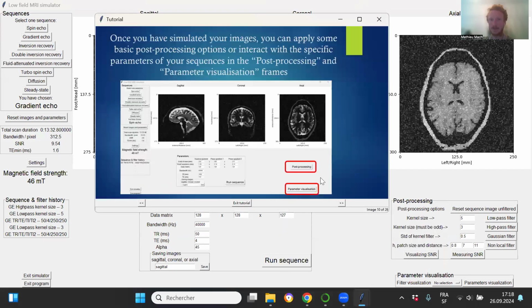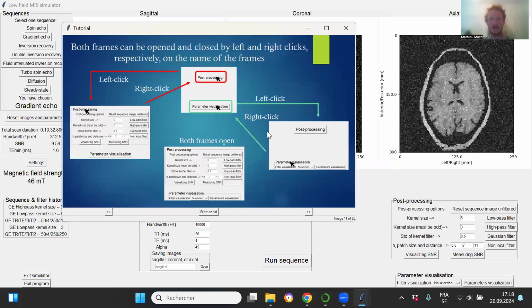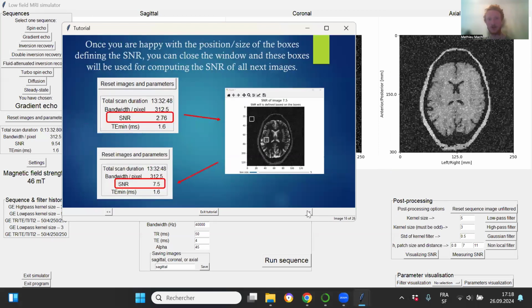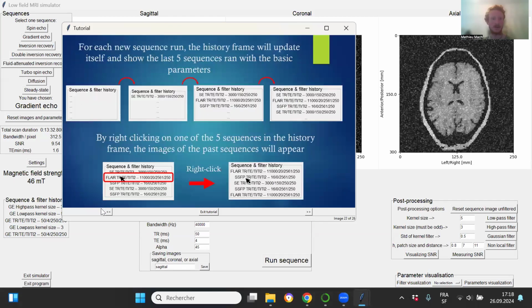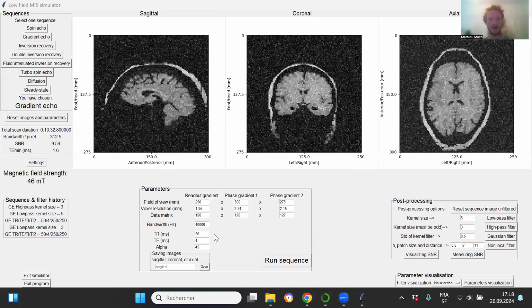And I think actually maybe I don't need to follow the tutorial here because it's maybe a bit more fun to have everything interactive. But everything that I'm going to show you now is in this tutorial, and you can always come back to it at any time. So I'm just going to quit this. Okay, moving the Zoom window, perfect.